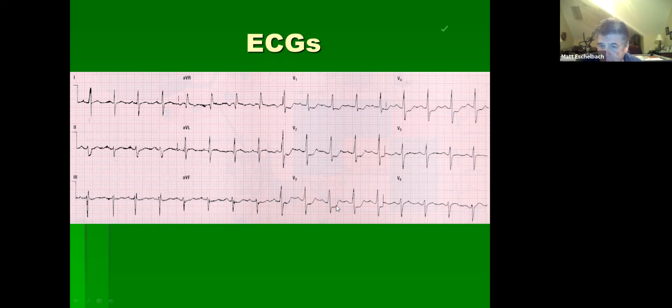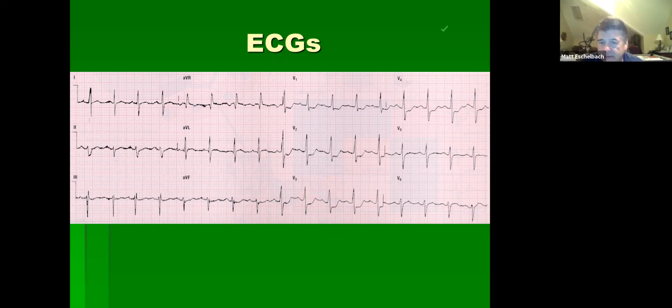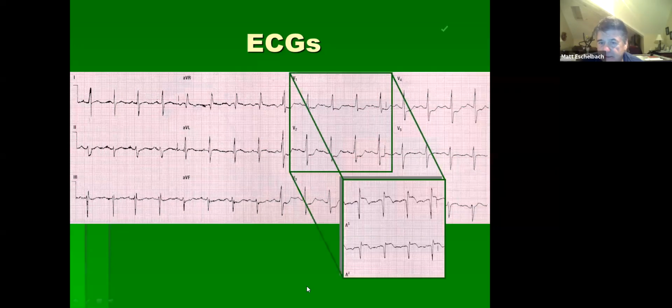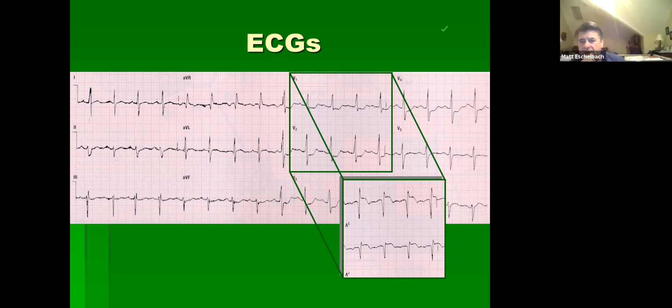All right. So if I were to take that EKG paper, flip it, and hold it up to the light, this is what I would see. Okay, so probably a posterior MI. So I'm going to go back and forth with that again.